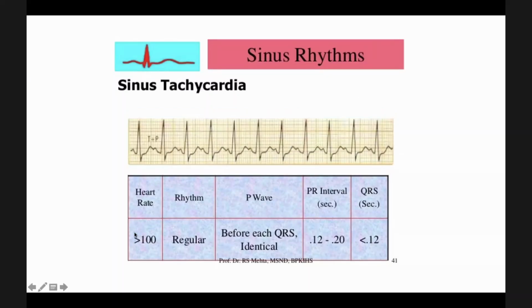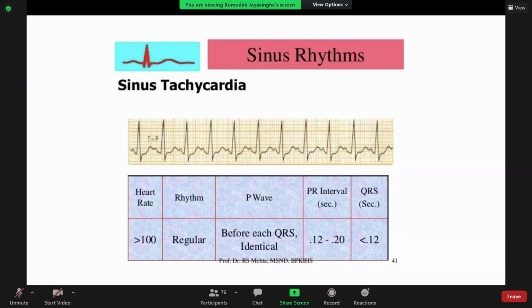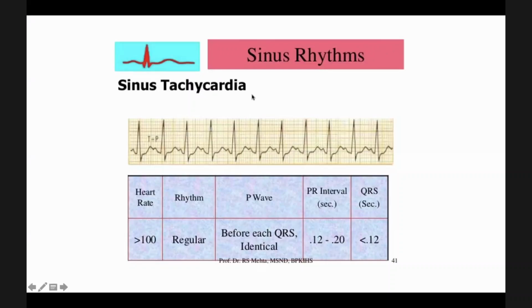And sinus tachycardia is when the heart rate is more than 100, and you call it sinus tachycardia. Why is it sinus? You get the P, QRS, and T pattern there, and the rate is more than 100, but usually the PR and the QRS are maintained. So some causes of sinus tachycardia: anemia, yes. Hyperthyroidism. Right coronary artery thrombosis.